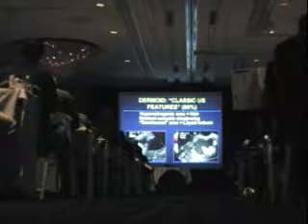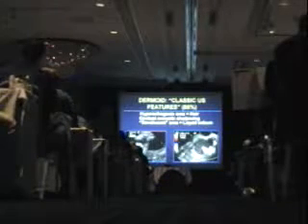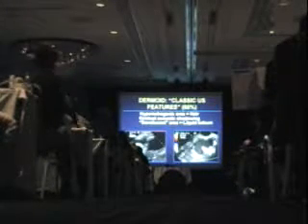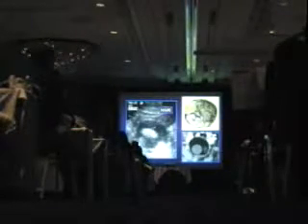And the sonolucent material is actually liquid sebum. It's like taking Crisco or butter, heating it up to body temperature, it liquefies. It's not in a cellular format the way fat is elsewhere in your body. So that's the liquid that we're seeing. And if you don't believe me, we have a nice CT there to compare it to. Classic for a dermoid.